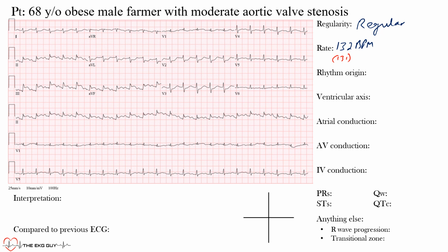All right, if you want to know one way to find it, I would use that initial approach that we used there. All right. So let's move on here, okay? So next we have to look at the rhythm origin, okay? In this case, I like to start, so we're pretty much here's our, this is why and you'll see why I use this approach, okay?